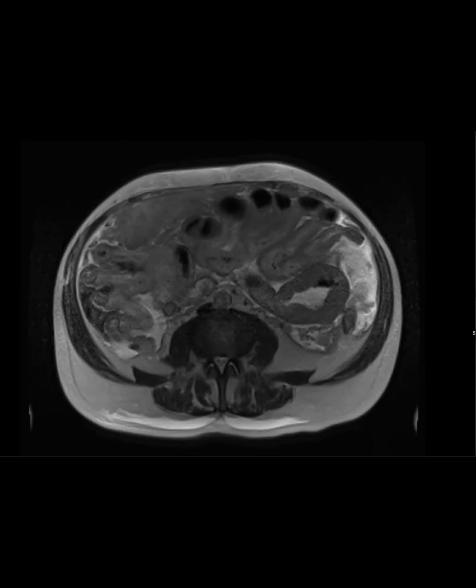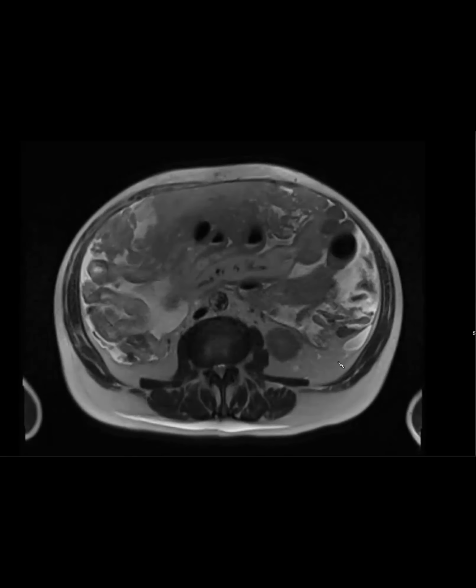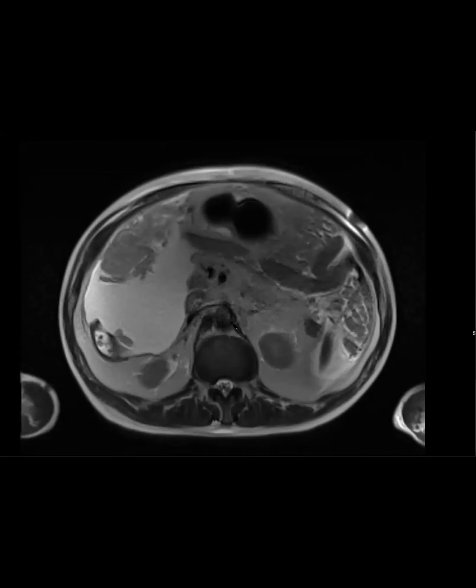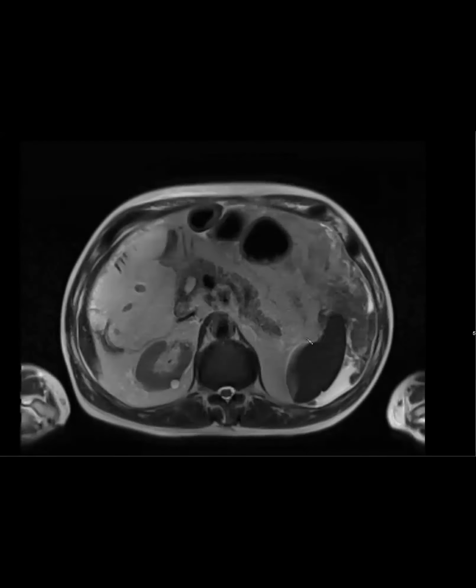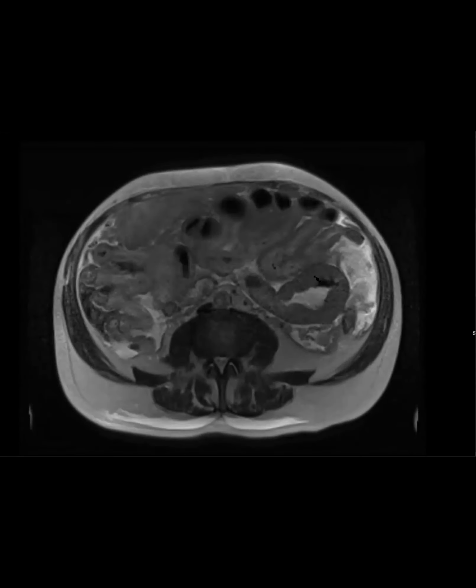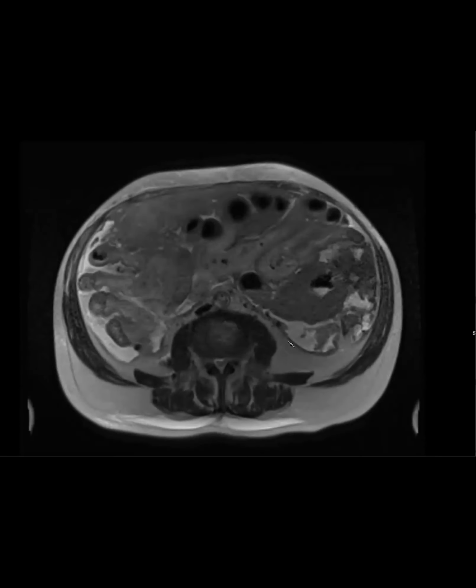Small bowel looks thick also. Great. Yeah, exactly. So this small bowel was thick and almost kind of dilated, like exactly, aneurysmal dilation. So like PTLD. Yeah, exactly. So the patient had a liver transplant and then had this aneurysmal bowel dilation and omental caking. So we're thinking about lymphoma in the setting of PTLD.